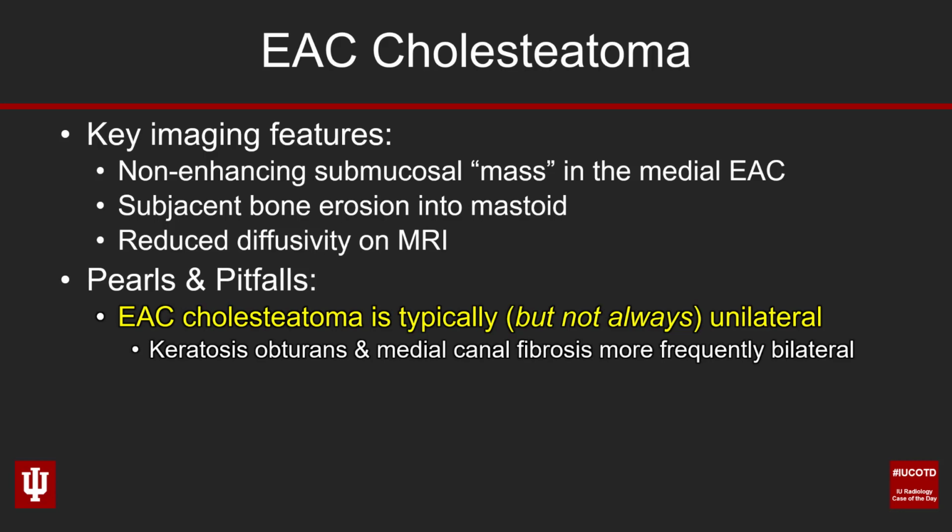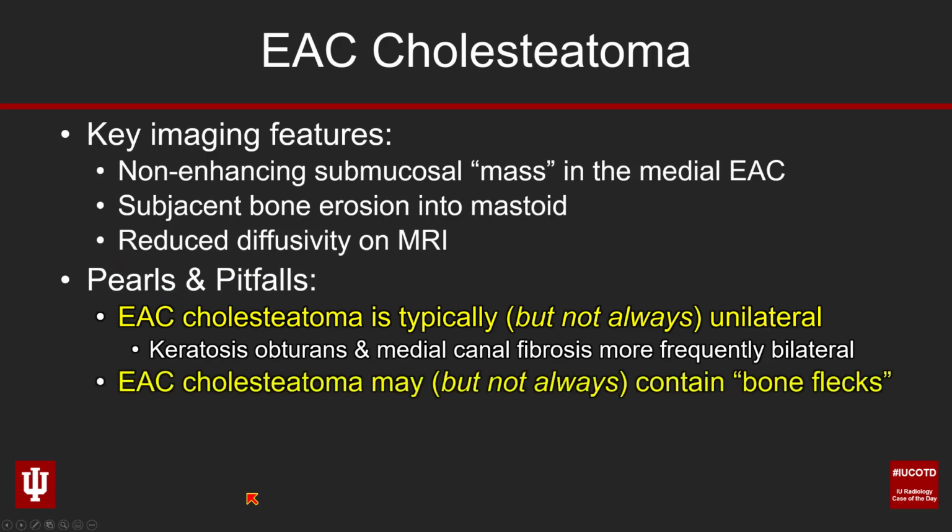That's in contradistinction to keratosis obturans and medial canal fibrosis, a couple of other soft tissue attenuation EAC lesions. Those are much more commonly going to be bilateral. Those hallmark bone flecks that are often attributed to EAC cholesteatomas, keep in mind, while those are frequently present, they're not always present, and this is a case that did not contain any.